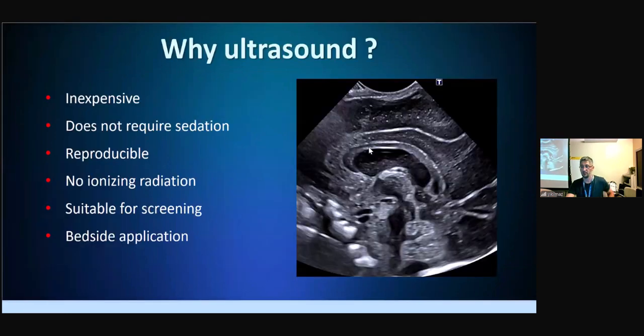So why are we doing ultrasound? Because it's inexpensive, does not require sedation, reproducible, there is no ionizing radiation, it is suitable for screening, and it allows bedside application. This is the superiority to MRI. You can do it at bedside. You don't need to sedate the patient. And this beats the CT, this beats the MRI.